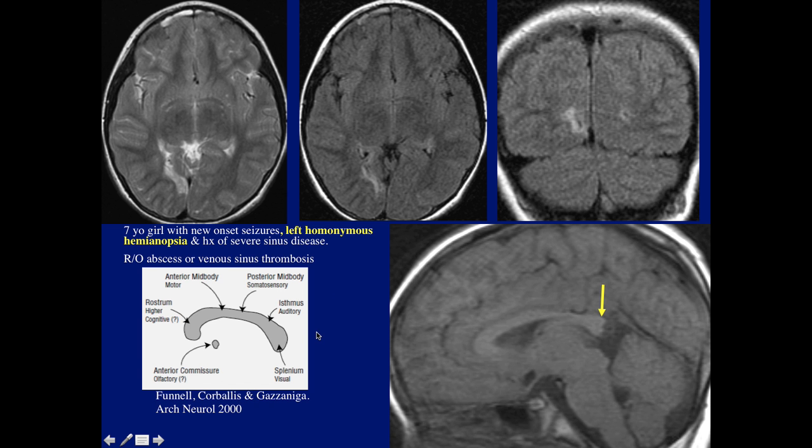So now we go back to this patient which I started off with. We can see how all these things can be explained by what happened maybe before birth or during birth or after. We can see here the lesion or some gliosis in the occipital lobe, which explains the visual issues. But notice that because of this amputated appearance of the splenium, there was something like Wallerian degeneration that involved the fibers going to the splenium. So this was not an acute finding; all these findings were chronic for a long time, either prenatal, perinatal, or postnatal.